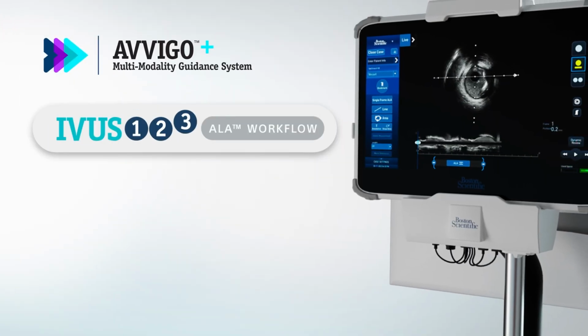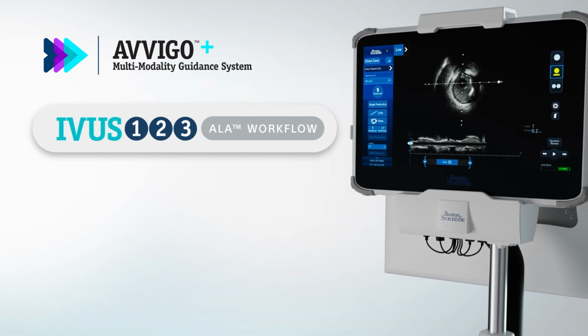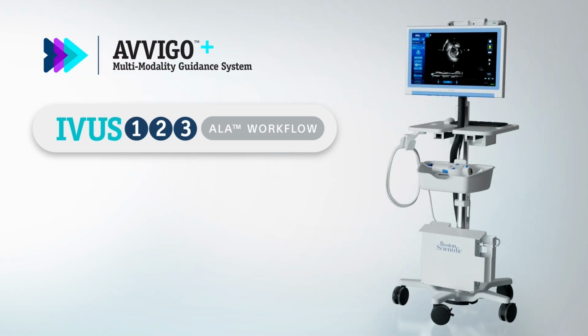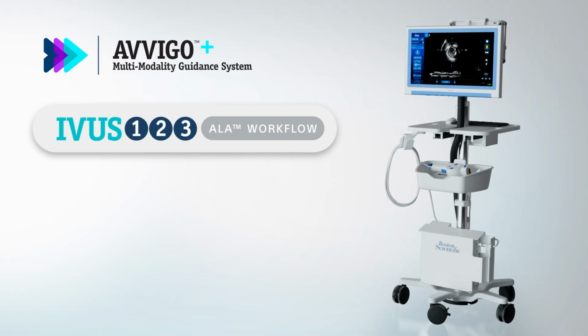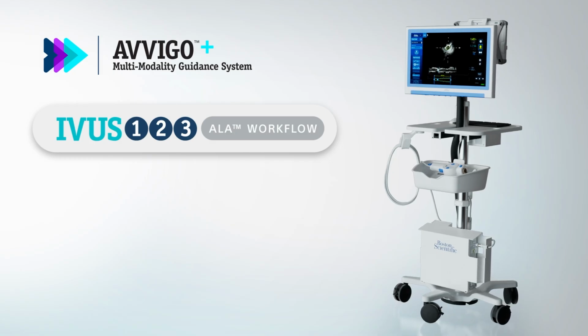Utilizing IVUS 1, 2, 3 in the ALA workflow helps clarify decisions, increase efficiency, and remove the guesswork. Supported by mounting clinical evidence, using IVUS throughout the PCI process helps optimize procedures and improve patient outcomes.